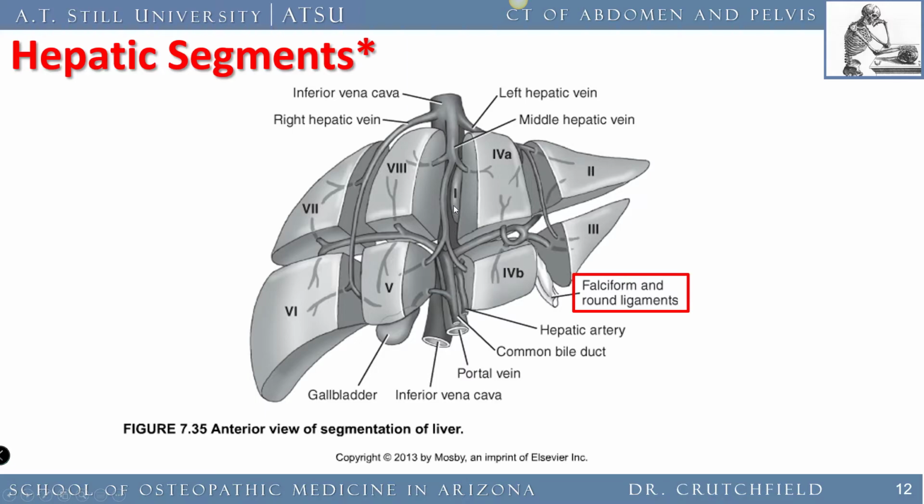And then we see deep down, there's a segment 1. We have a 4A and a 4B, 5, 6, 7, and 8.